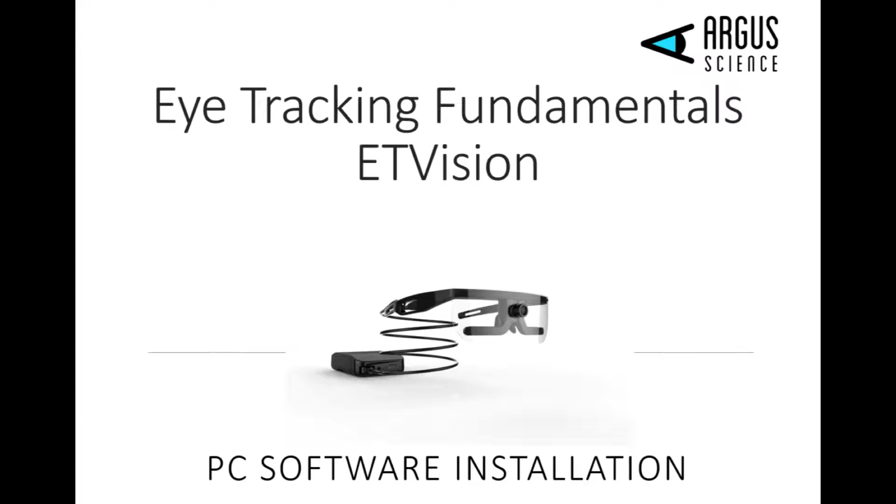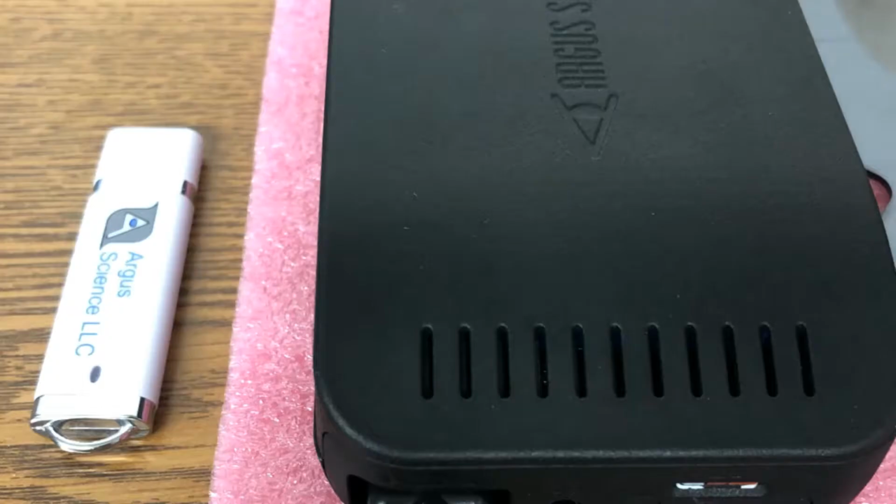Today we're going to talk about installing the ETVision software on your PC. You should have received with your shipment a USB drive, which has on it an installer for the software as well as a PDF file with your activation codes for online activation.